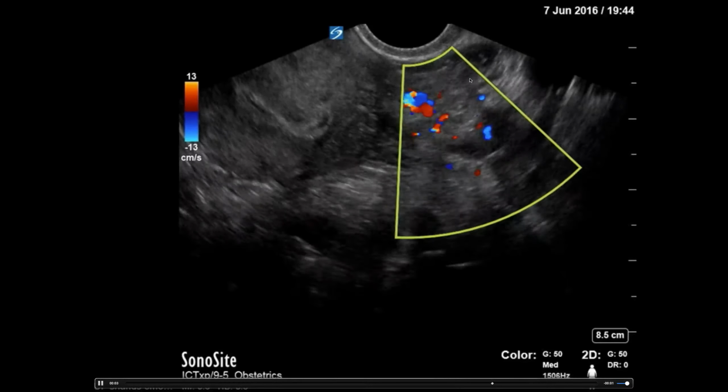So just to train your eyes some more for a good adnexal evaluation, here we're looking at our adnexal sweep again. And we see the complex adnexal mass here, and then a normal ovary here, and iliacs there. Same thing when we place color on the adnexal mass: iliacs, uterus, adnexal mass, and normal ovarian tissue seen right here.